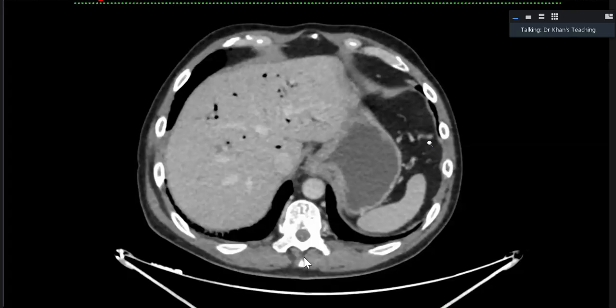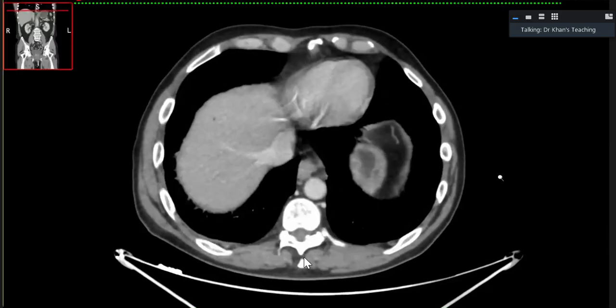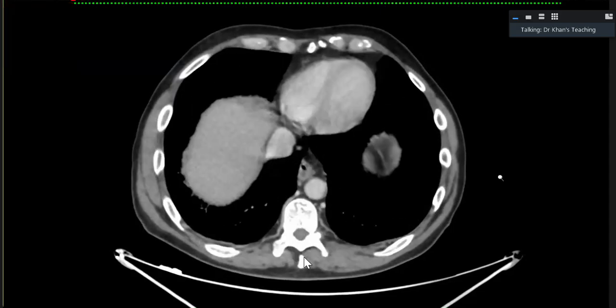The patient presented with jaundice, and the gastroenterologist have done an OGD and have done a procedure. After the procedure, some symptoms have occurred, pain, etc. So they have asked for this CT scan. Over to you.